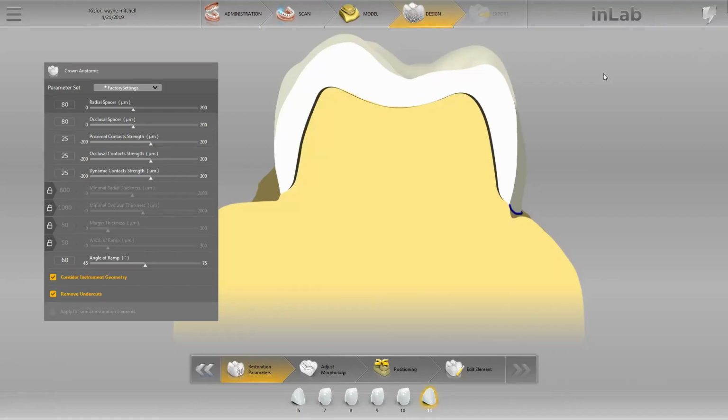Hope you guys enjoy. Hey everyone, just wanted to get a quick video of this design. There may be some tips and tricks involved to improve this patient's smile. I haven't started this design yet, so you guys will be seeing everything live as it happens. But this patient has somewhat of an underbite. It's not too severe. We'll see what we end up doing. I'm thinking it's going to be more of an end-to-end bite by the time we get done with the design.